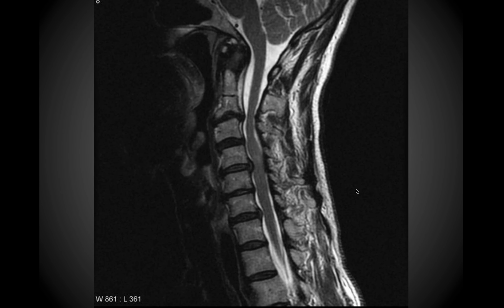Here we have a cervical sagittal MRI scan. I'll give you a second to look at it and see if you can identify where the issue is. There's actually a couple of them in this image, but if you look at the anterior aspect of the thecal sac, so the dura, or the posterior vertebral line back here, you'll see that it's not really forming a smooth line. You see these bumps here, and especially up here, you can see an especially large disc herniation. You can see a small one right here and another one down here.